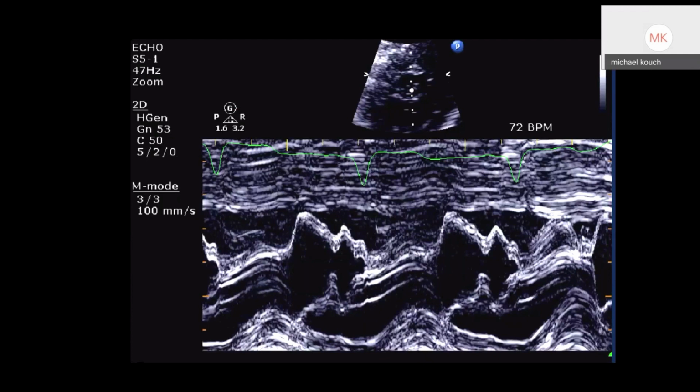Really, she obviously didn't do well. All right. So let's go through this here. What is different? This is obviously an abnormal picture. There's something that's abnormal here. So let's go through it very classically. So let's start with our E wave. Does our E wave look different? No, E wave looks good. We move down towards diastasis, and our A wave. Does that look good? Okay.